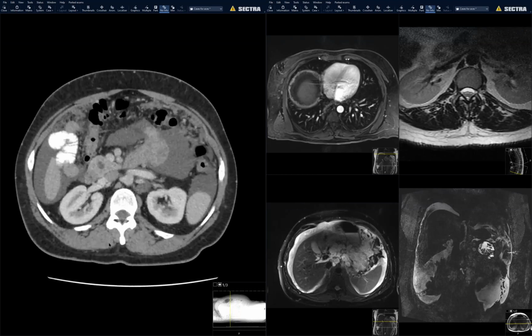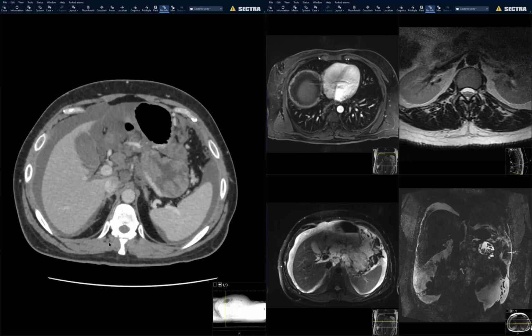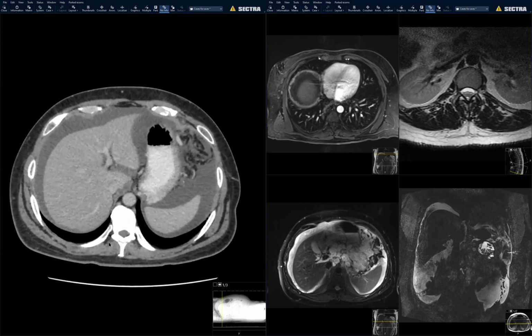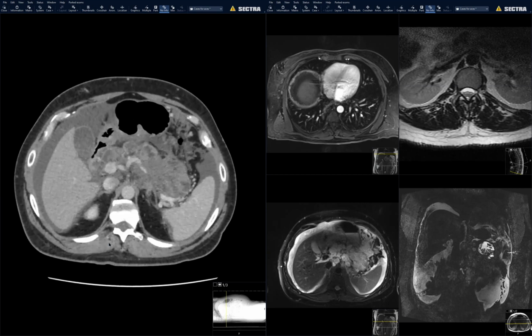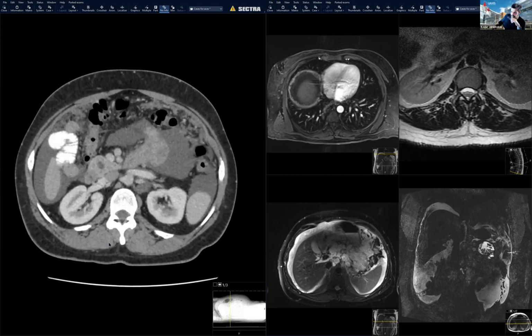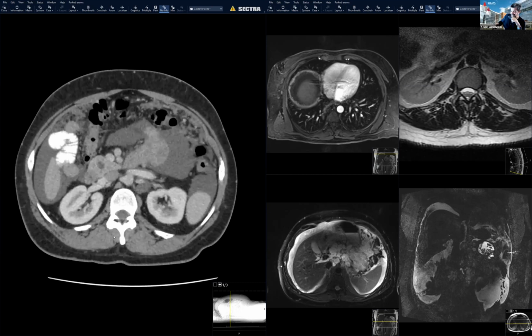I was seeing a bunch of nodular masses in the pancreas and the omentum. Okay. And maybe a dominant mass in the pancreas, like cystic and solid. Okay, and so looks unusual for adeno. So I'm thinking of things like that. And actually, is it growing in the duct? That's a great thought.